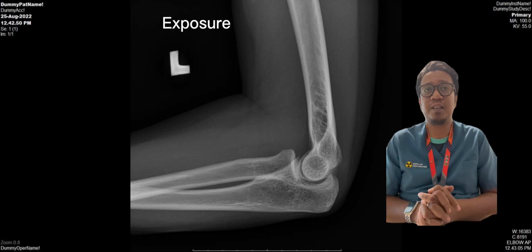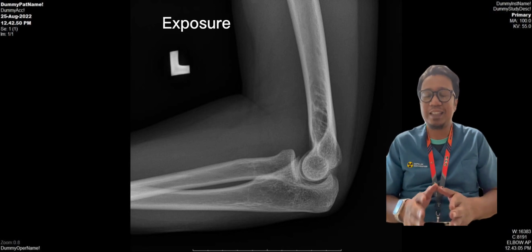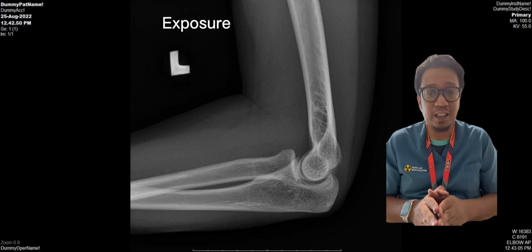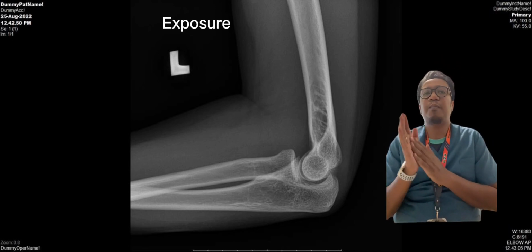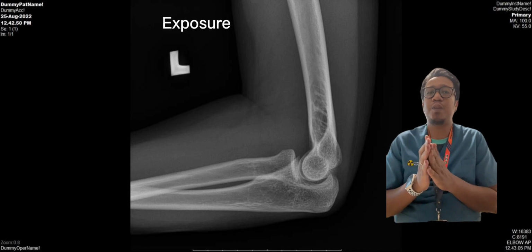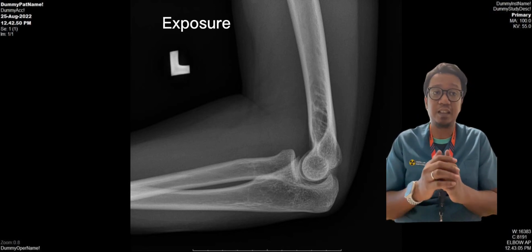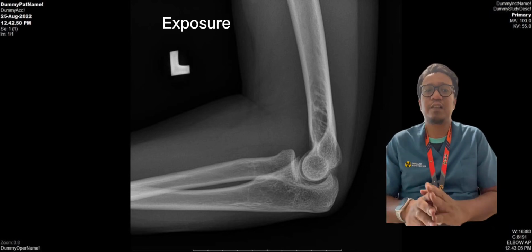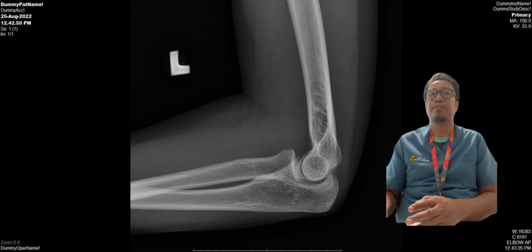The mAs used is adequate for detail and density. This is because the bony trabecular pattern of the thin structure, the humerus and radius ulna, can be seen clearly in the radiograph. And the bony trabecular markings of the thick structure, which is the lateral and medial epicondyle superimposed on each other, also can be seen. There is no need for any changes of exposure for this radiograph.